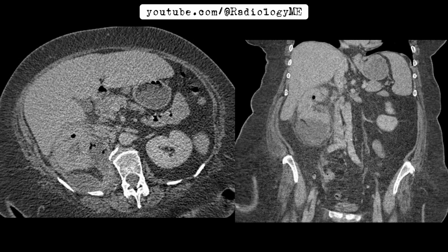We move to the CT scan for further clarification. Now, the CT images tell us a more detailed story. The right kidney is again notably enlarged, especially at the lower pole, where we see a low-density area, likely a collection of fluid. But what's more concerning are the multiple gas locules scattered not only within the renal parenchyma, but also in the perinephric space.